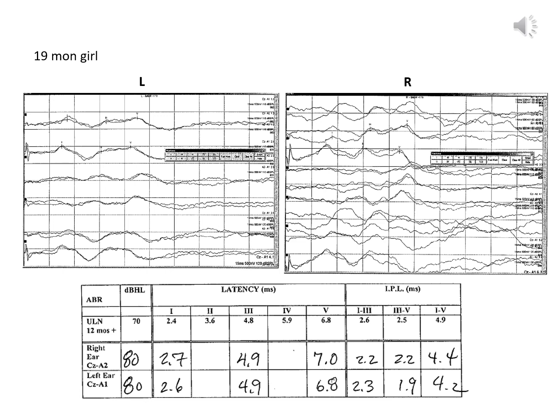And so starting on the left ear, we'll see the 70 decibel recording with a fairly clear 1, 3, 5, and then repeated for the 80 dB with a very clear 1, 3, 5. And then on the right ear, the 70 decibel recording is very poor and not reproducible. And then the 80 dB is still quite poor with a much clearer 90 dB recording, but we can see the 1, 3, 5. And so the technologist has written for us the numbers for the waves 1, 3, and 5, as well as the interpeak latency numbers.